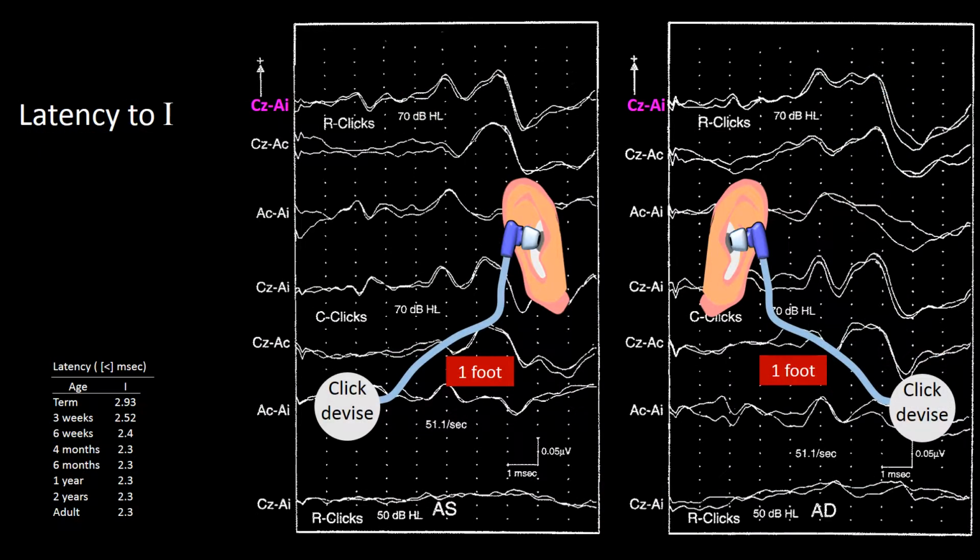As you can recall, this study was done using special ear stimulus equipment that does not produce a stimulus artifact, but does produce an additional delay between the stimulus production and the arrival of the stimulus at the basilar membrane of the cochlea. This delay is about 0.9 milliseconds.